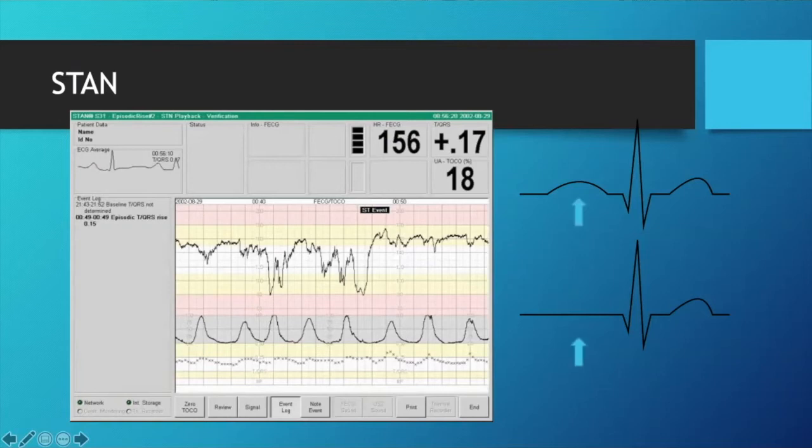But this is not absolute, okay? And that's very, very important. We've seen cases when babies have shown, so we've seen this wave and this turned out to be mum. And Rosie can tell you about the case that actually happened at St. George's with that, okay? So yes, it's an indicator, but it's not an absolute fact.